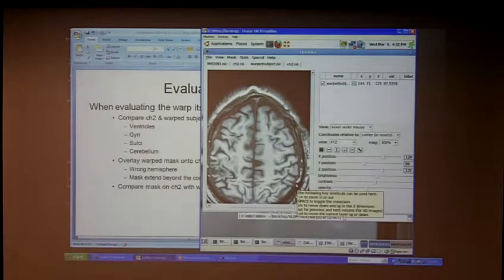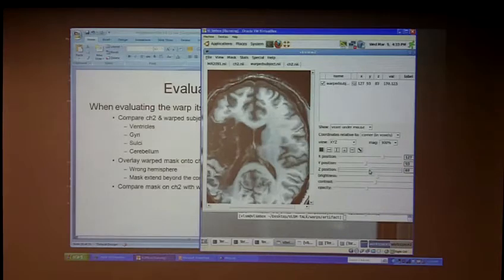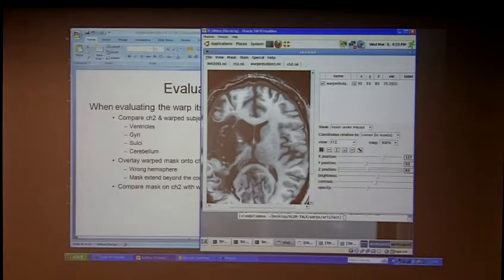So I just want to ask you, the amount of distortion of the ventricle that you see here is not problematic. I mean, there's some enlargement of the ventricle. Is that what it typically looks like? You're talking about this? Yeah. I'm just wondering what a troublesome level is.